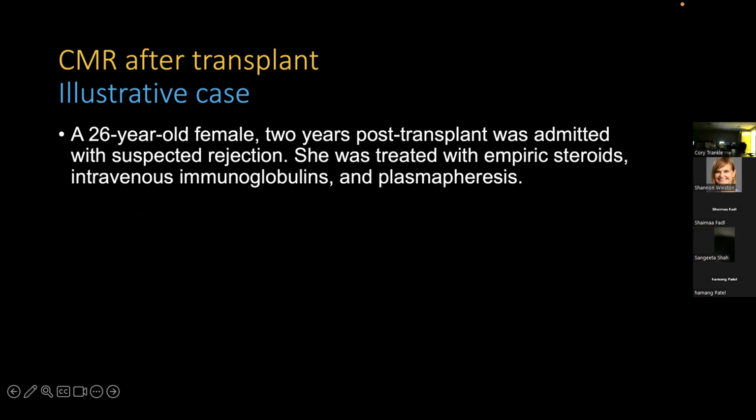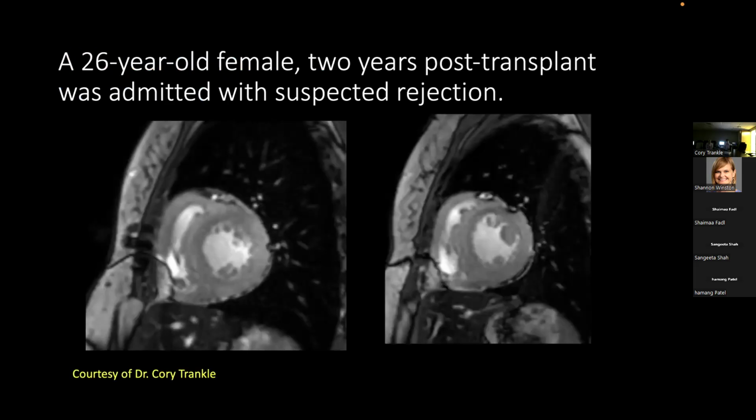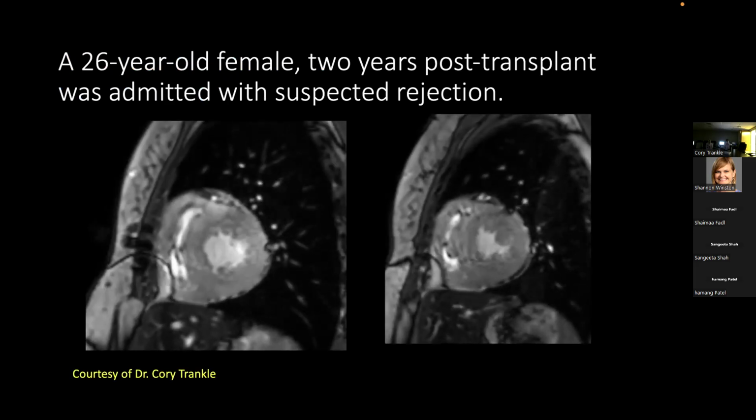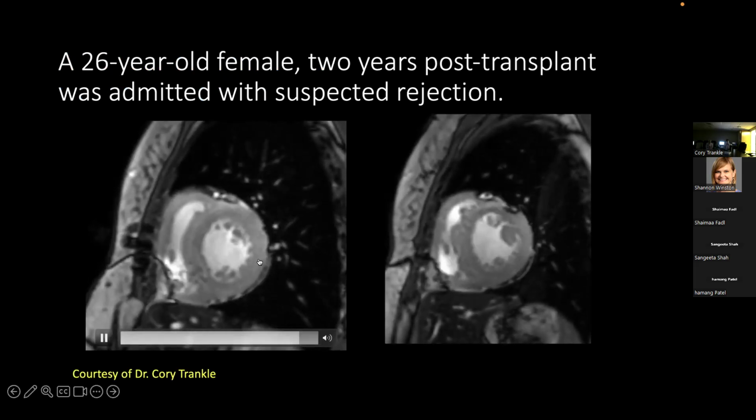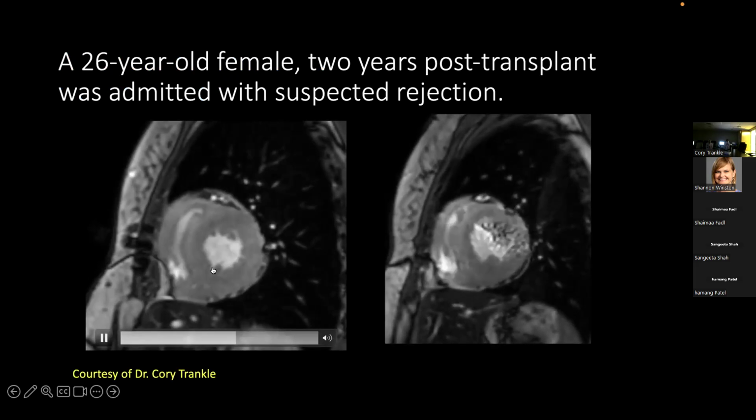Let's start with that illustrative case about rejection. This is a patient, a 26-year-old lady, 2 years post-transplant, who was admitted with suspected rejection. And then she was treated with empiric steroids, IV immunoglobulins, and plasmapheresis. And this was the cine images in short axis. And it shows that the myocardium is relatively hypertrophied.